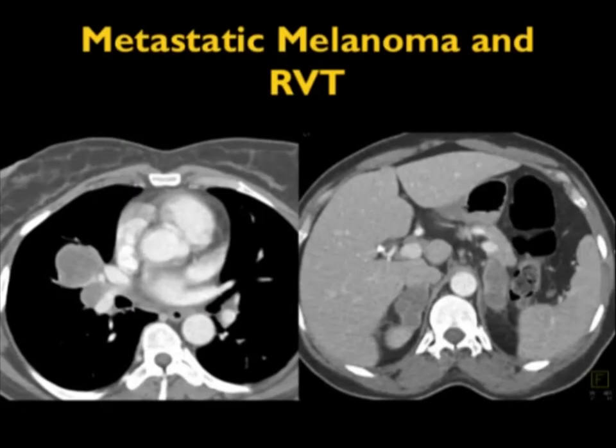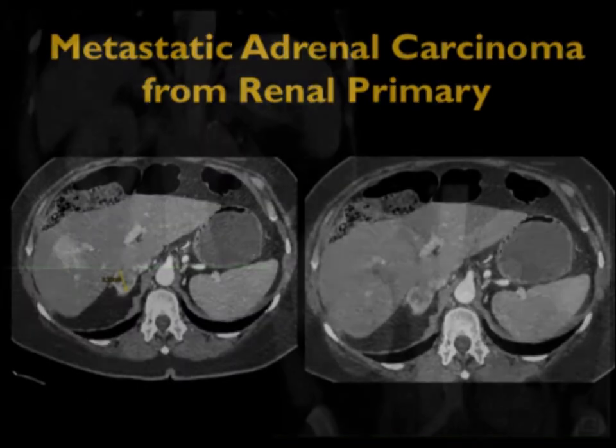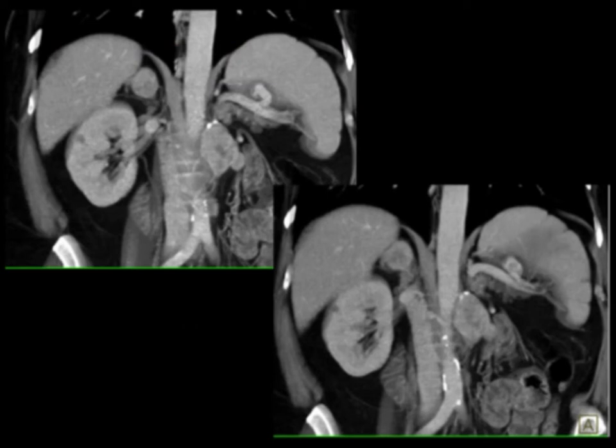Look at this large lesion in this case. When I think cystic, I think about things like melanoma, but it doesn't have to be melanoma. Here's a case with melanoma, the most common bilateral I think of. Melanoma, you can see adenopathy present. And I mentioned when lesions are vascular, you've got to think about renal, especially when the patient is missing their left kidney and you see nodes by the surgical bed.